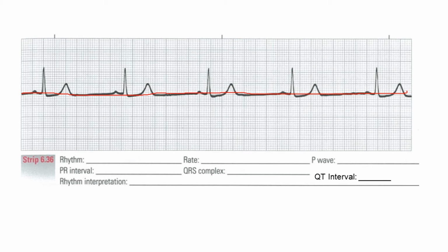So we have a scenario for this patient. The rhythm belongs to a 72-year-old female who was brought to the ED after having been found barely responsive at home. She is arousable, but complains of feeling very dizzy. Her blood pressure is 68 systolic by Doppler. So that's pretty low, you can't even get a good blood pressure normally. So we're going to say she's symptomatic bradycardia.